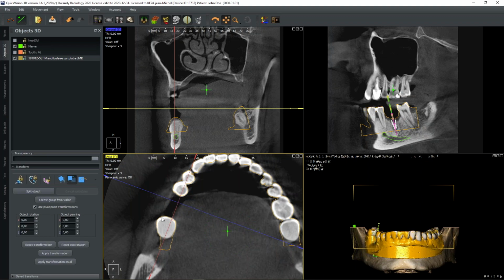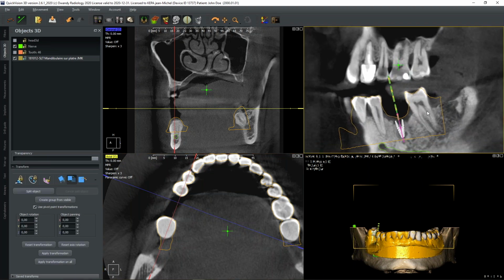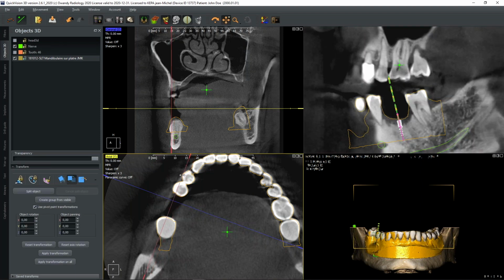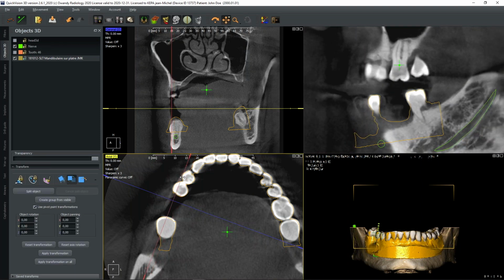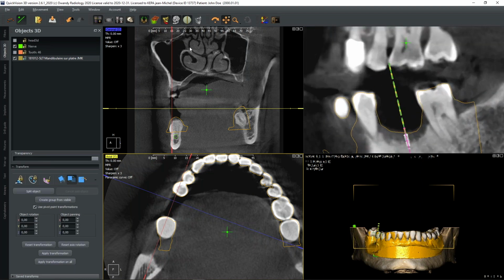I realign my position smoothly. I may also check the profile of it, and I may also, by hand, realign the position smoothly. Okay, and you may probably see in that view here that the soft tissue is in contact with the profile of my STL file.